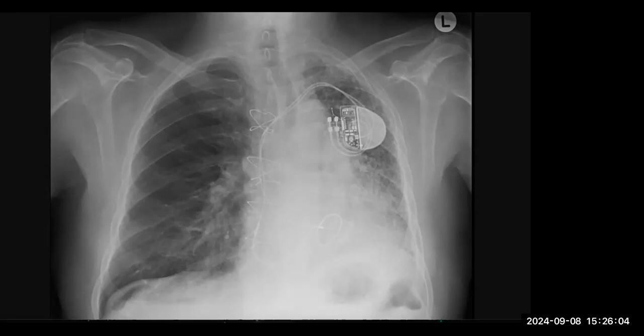So, if you think it's an underlying interstitial lung disease, could you tell me the possible etiology in this case? What would have caused the interstitial lung disease? I would compare the previous radiographs to see whether it is a unilateral lung disease or a bilateral. Let's assume that this patient had bilateral interstitial lung disease. With the available image, can you come to a possible etiology for it? So if it was unilateral, then I can see multiple cystic lucencies within and it is diffusely distributed.